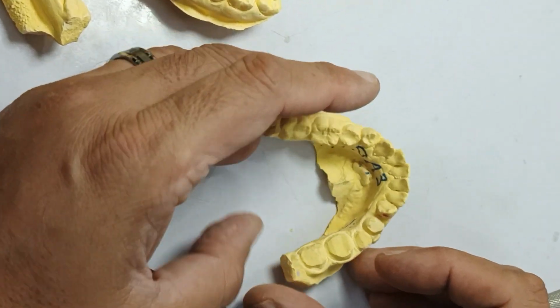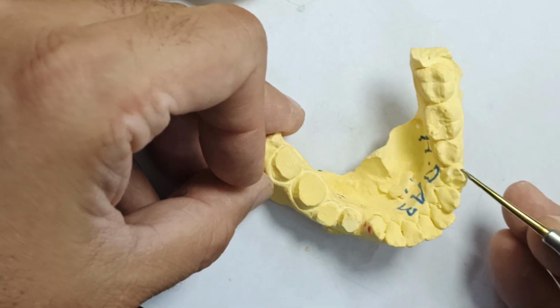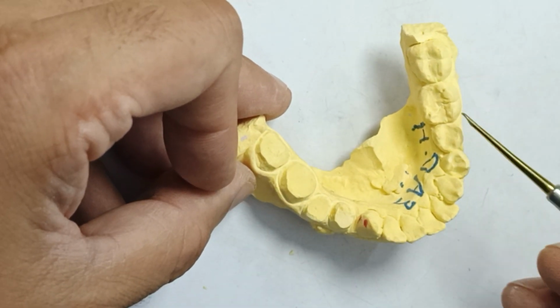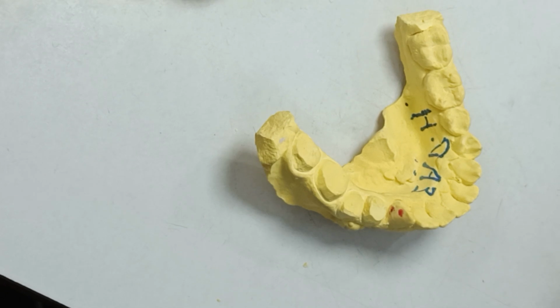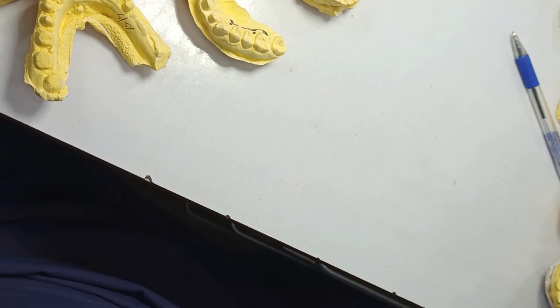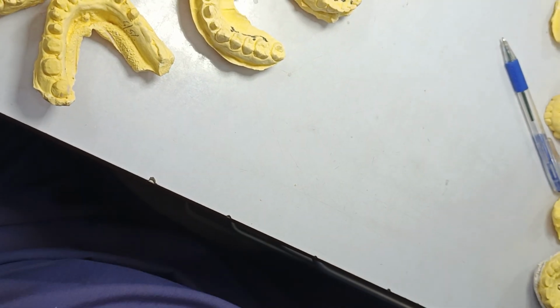Look at this. The preps. There's no facial reduction. It's out of the arch. This is the case. Very likely, I can almost bet, if we see the original, all the patient needed was some ortho, and they could have benefited from it. So if the patient does not accept your treatment, tell him, I'm sorry, I'm not gonna do haram for you. I will do only halal. I cannot hurt you. And you know what? If I take a look, I'm not gonna show you, but there's about 60 to 70 units of crown that still need to be made, and each one is a worse example than the last.